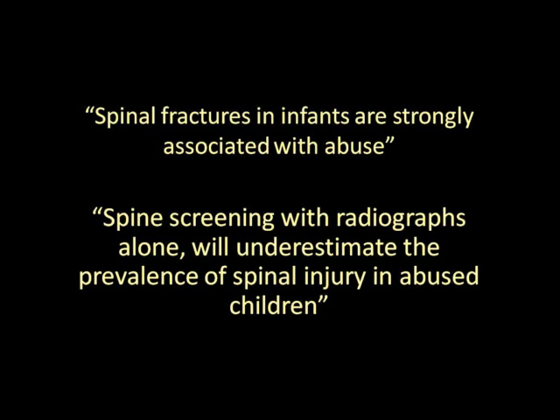So in the next 30 minutes, we're going to review imaging of spinal injuries in abused children. And I'd like to start with the take-home points. The first of which is spinal fractures in infants are strongly associated with abuse. And the second is that spine screening with radiographs alone, which is our conventional way of screening spines and often the only imaging that we perform of the spines, will underestimate the prevalence of spinal injury in abused children.